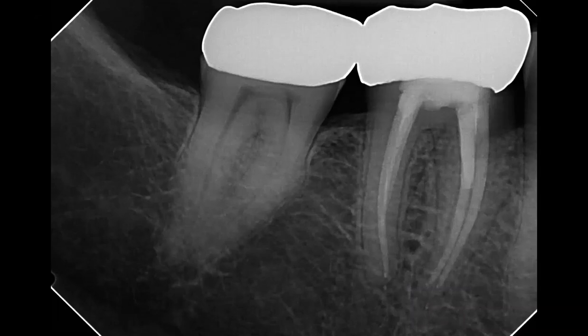This patient presented for evaluation of biting discomfort in the lower right quadrant. I checked teeth number 30 and 31 and found that tooth number 31 had a normal response to percussion, bite, and the application of cold. Tooth number 30 had a slight response to biting, but was normal to percussion. The conventional film did not reveal apical pathology or vertical root fracture.